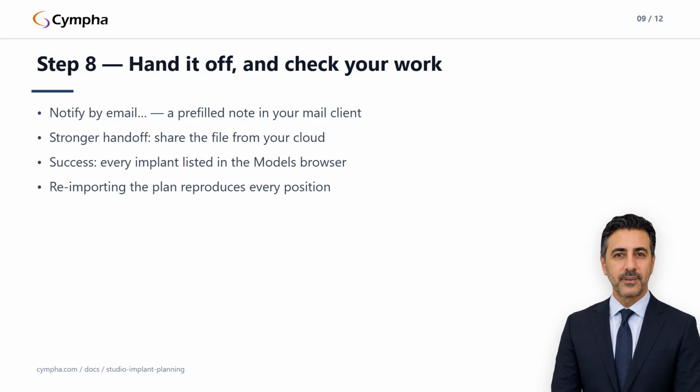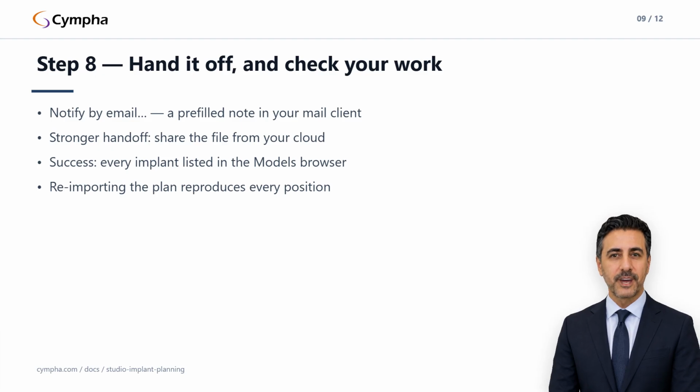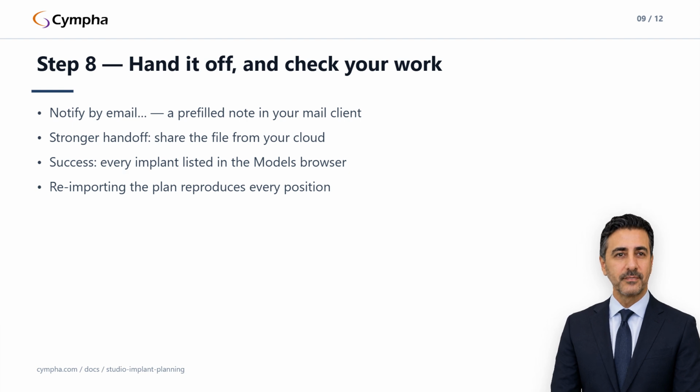An implant plan file exported here imports cleanly into GuideMia implant software on the desktop, and the reverse also works, which is the subject of the companion guide on implant interoperability. So a plan sketched in the browser at chair side can be finished on a desktop seat, and a desktop plan can be reviewed in a browser by someone who has no seat at all.